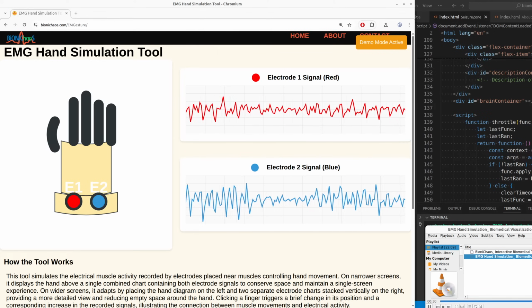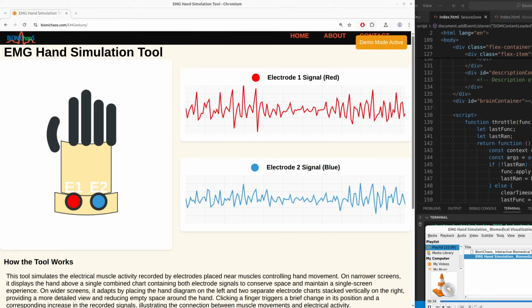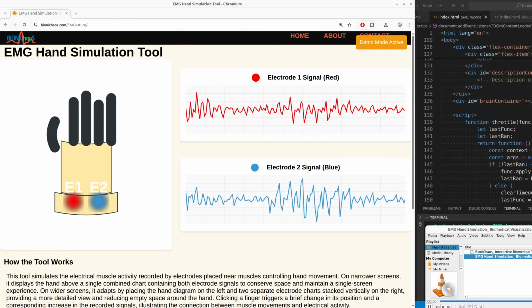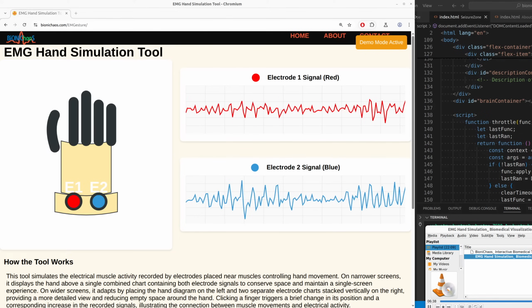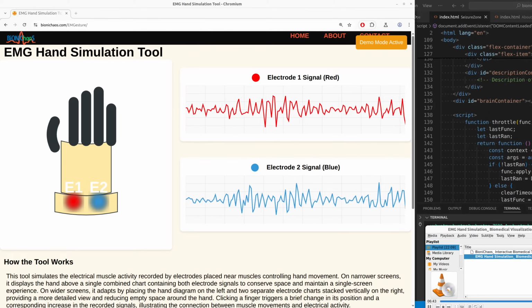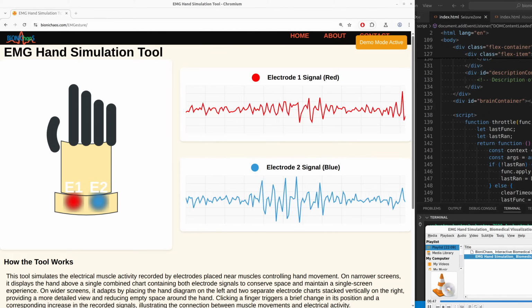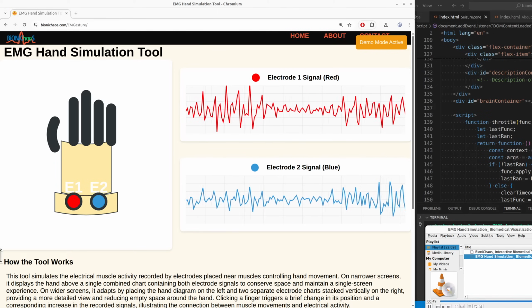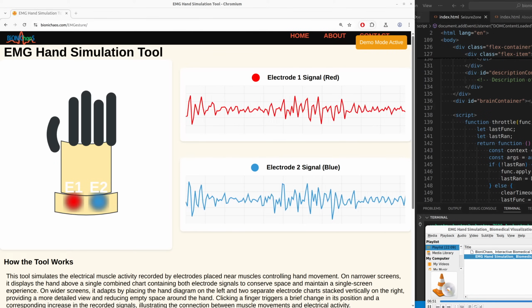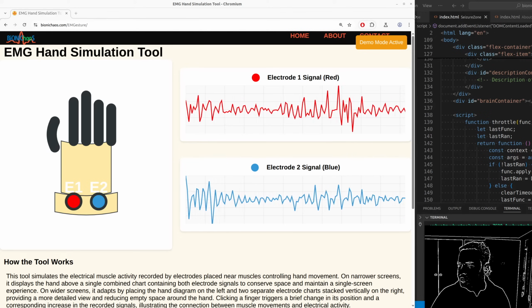So for someone wanting to learn about EMG, this sounds fantastic, but we need to be crystal clear. You wouldn't use this for any kind of real-world research or, say, medical diagnosis. Definitely not. It is not intended for diagnosing neuromuscular problems, guiding physical therapy, or anything like that. It's a simulator, a teaching aid. Think of it like a really sophisticated interactive textbook diagram, not a lab instrument. That's a really important distinction to keep making. Educational tool, not diagnostic.